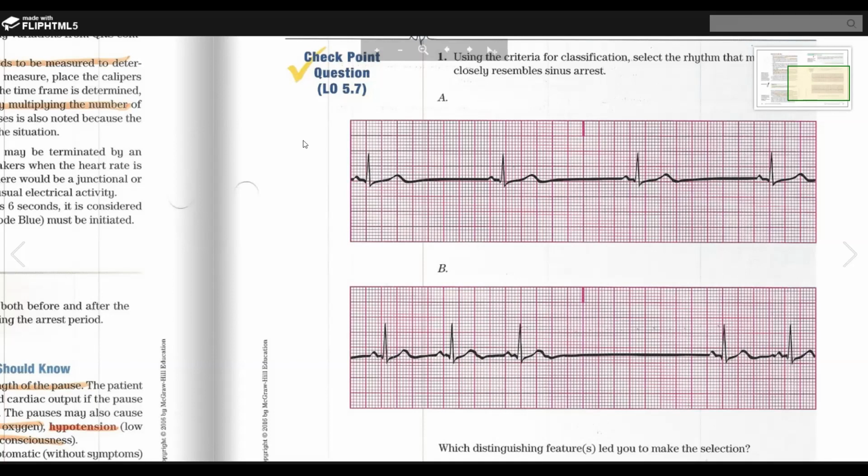Why did you say you did 13 times 0.02? Because one little square is 0.04. So where do you get the 0.02 from? I don't know. I think that's what he said to multiply by. Ahorita que venga le preguntamos.